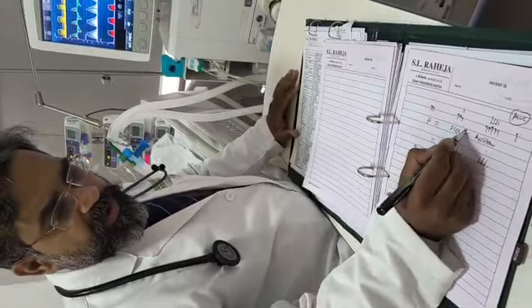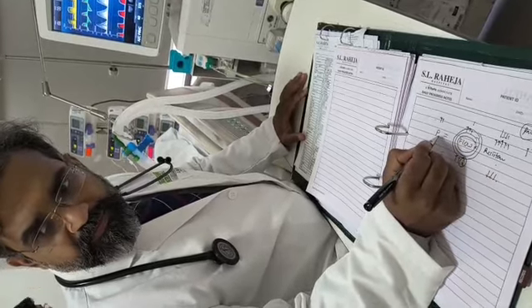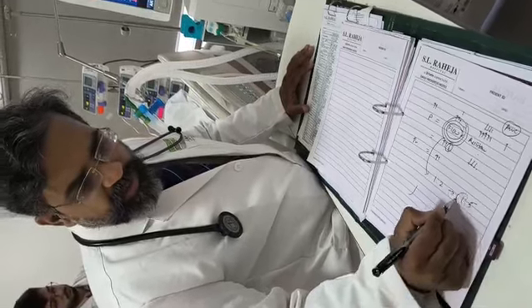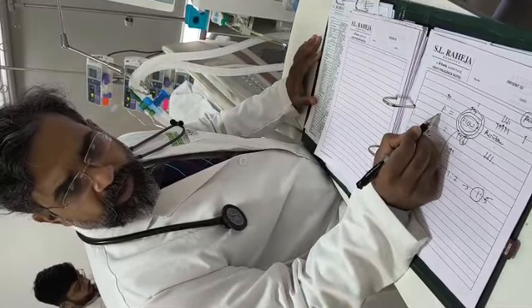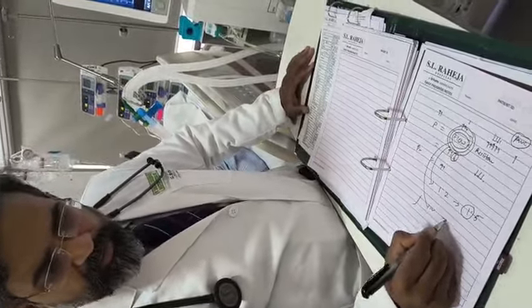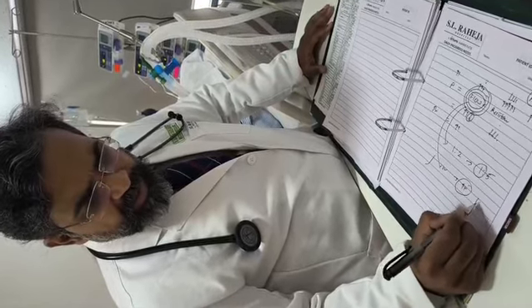So this means if I increase the flow in any way, I can reduce the change in the pressure. If I increase the flow by changing the I:E ratio from 1:2 to 1:1.5 or so, the flow is increased, and the pressure artifact will not be seen. Similarly, if I increase the tidal volume, I will again have increased flow, which will not allow this to be seen, per se, because I'm keeping the I:E ratio constant.